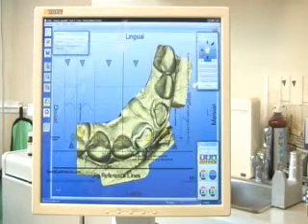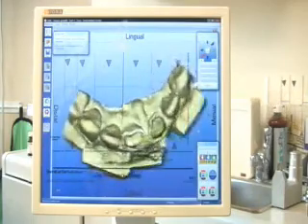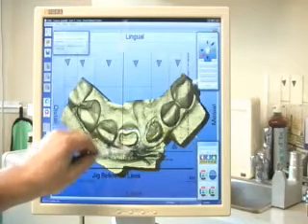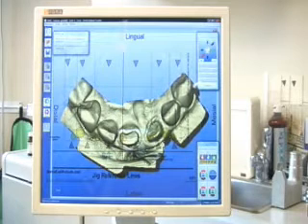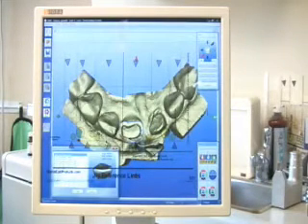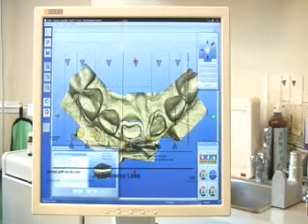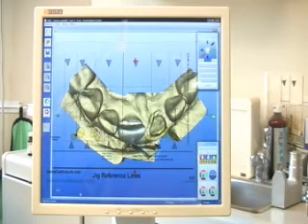When we have these larger virtual models, a lot of the times we will have to correct the insertion angle. At this stage, it's also good to rotate the model so the labial of the preparation is lining up with the labial marker on the screen, and will allow the software to generate a better proposal for you. It will also aid when manipulating the proposal with your positioning tools, allowing you to move it in a true labial, true lingual, true mesial, true distal direction.